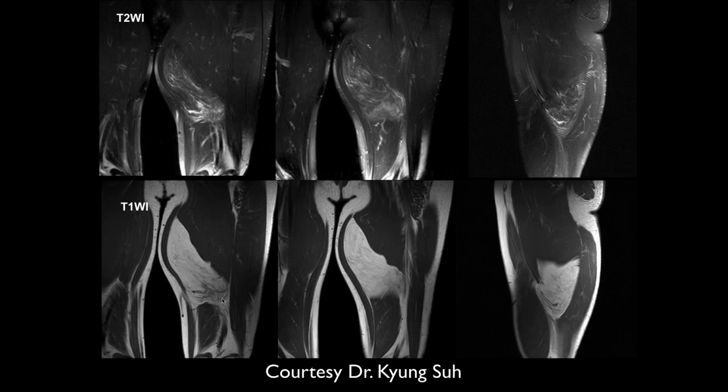No. Well, in a situation like this, what I do is I dictate this and say that the inferior aspect is not clearly benign, and then you talk to the doctor on the phone. But I do not describe this as a benign lipoma. I describe it as a primarily lipid-containing mass. Within the inferior aspect there is septal and nodular thickening, which is not clearly benign. And then you need to talk to the physician, that's the feeder site, and you can always say suspicious, or whatever. Right.